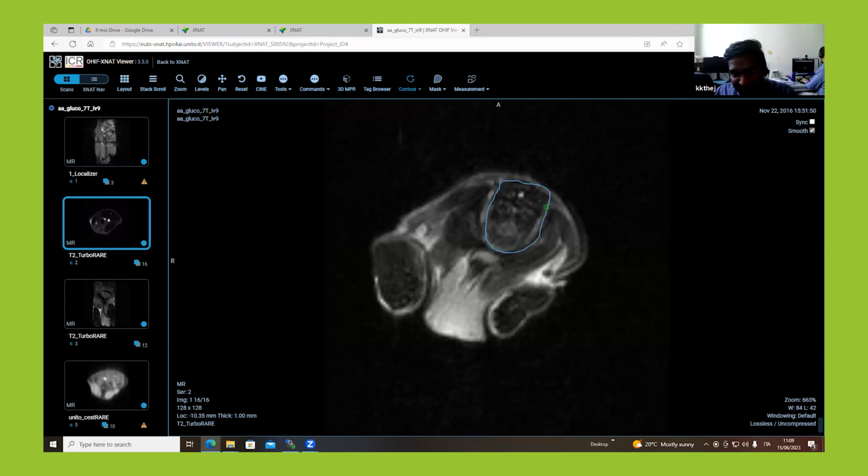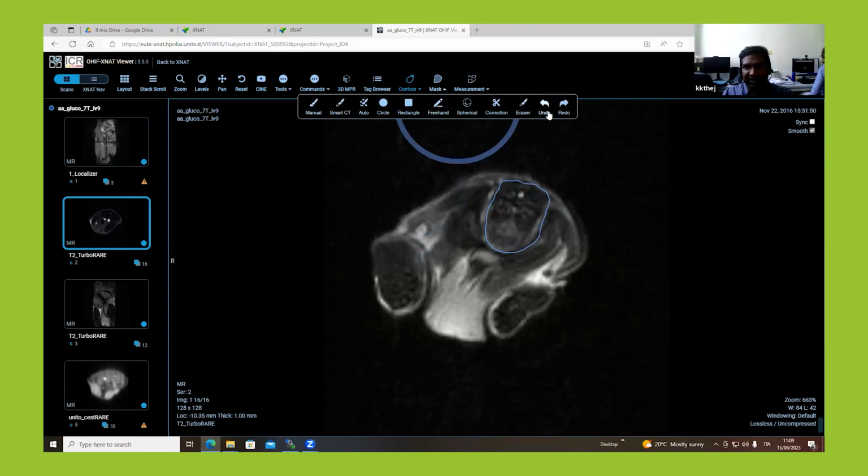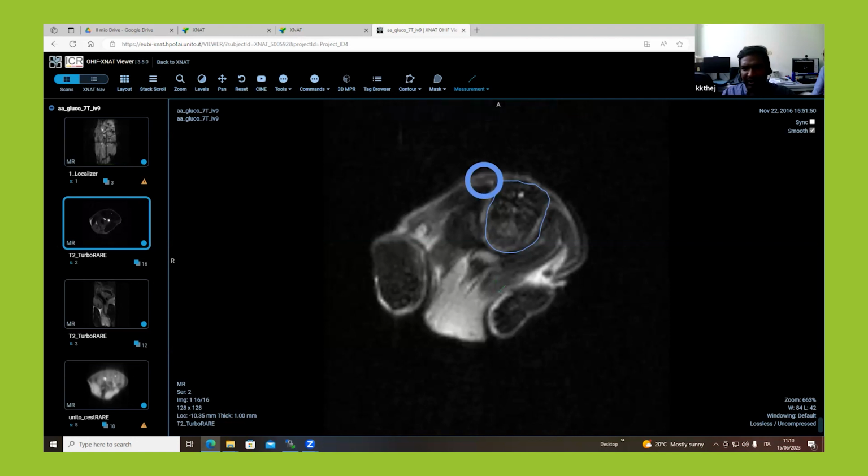And then if I'm not sure that it is well done, you can slowly sculpt it, and you can very easily select the part that you're masking. You can create the mask. You have a lot of options here as well, and you can take the measurements. Let's say if you want to see the length of a tumor or length of a tissue, then all the measurements that you can do here, annotation like angle, you can do bidirectional, ellipse, and also rectangle.